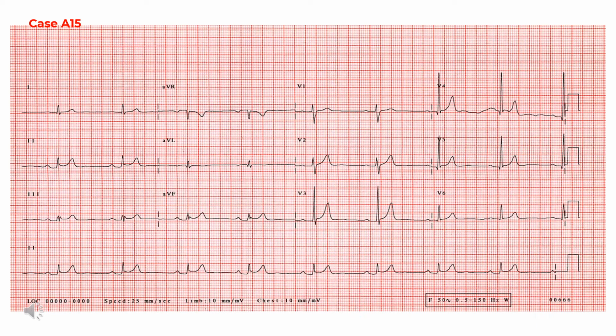Acute ischemia is a localized process, and the ST changes are restricted to the leads that record from the area deprived of oxygenated blood. In this ECG, the ST elevation is present in all leads except aVR and aVL. aVR is an intracavity lead and shows ST depression, a reciprocal change. Lead aVL is at right angles to the frontal plane axis and shows only a small QRS deflection, and there is no significant ST segment deviation.